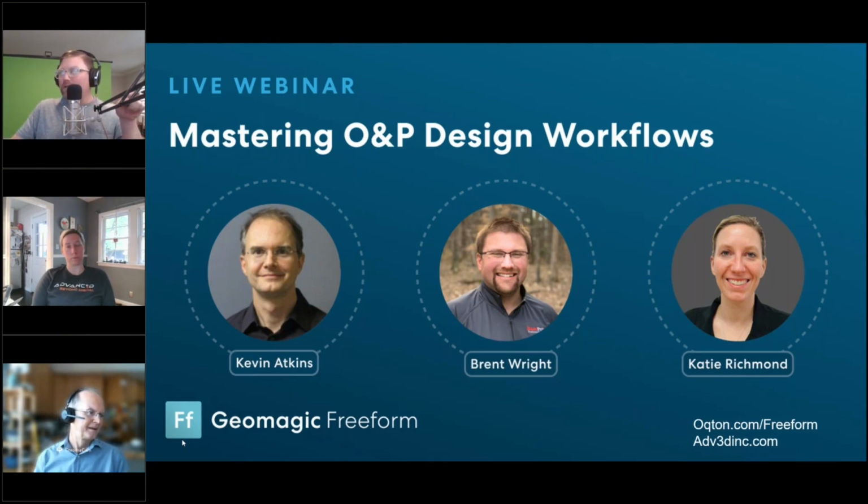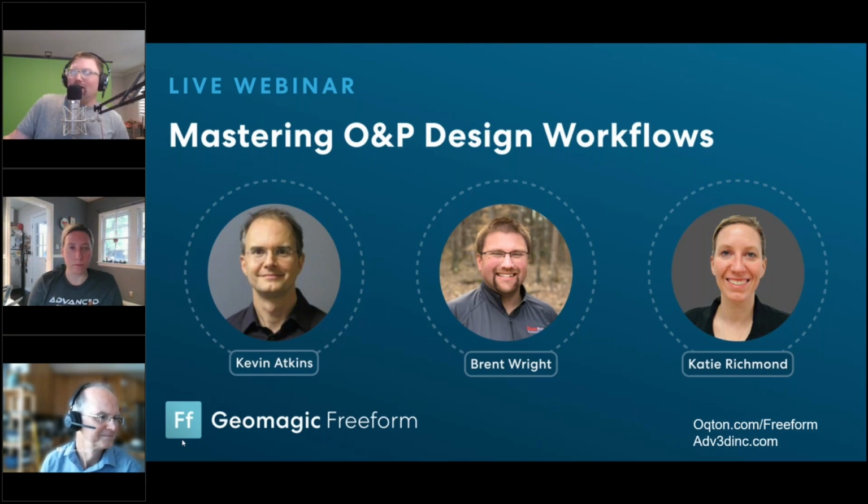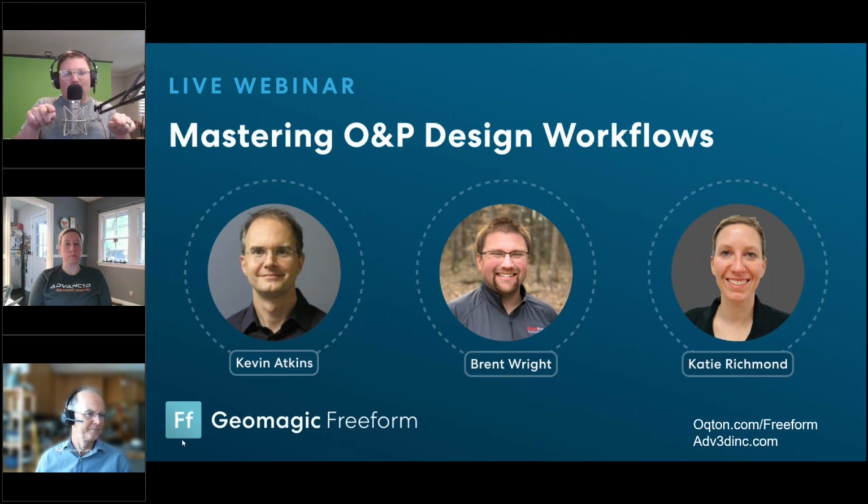Kevin, I wanted to touch on this. We touched on it a little bit. If there is a Boolean operation to be performed, do we need to convert the clay into solid mesh, then perform? Okay, so it probably wasn't the best example for me to do it the way that I did it. It's the way that I do it, and I used to not do it that way with the mesh, but the emboss tool now will poke through thin surfaces.